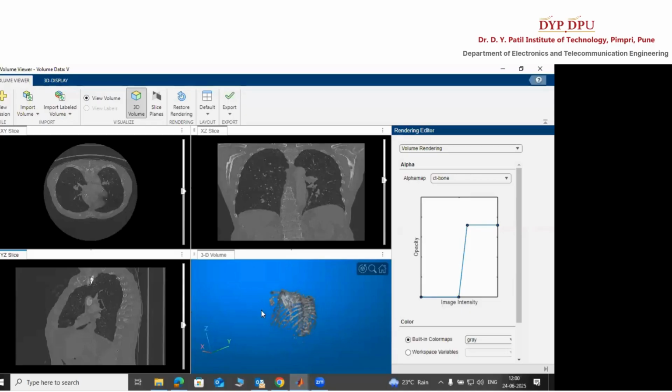Those who are working with the downloaded version, are you able to find this? Or you can customize this value also, if you want to customize the image intensity.